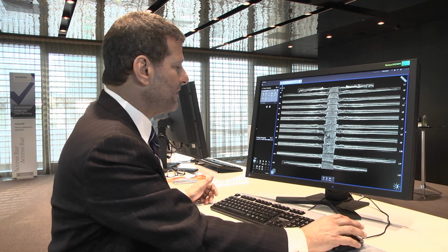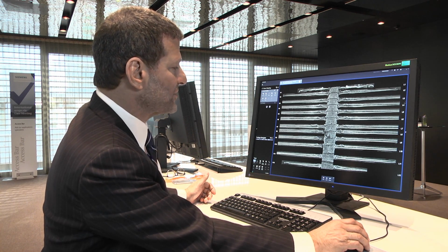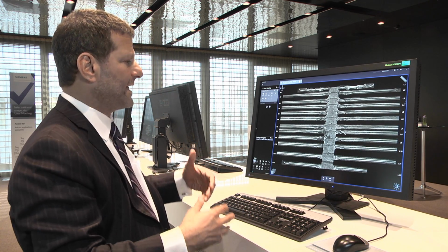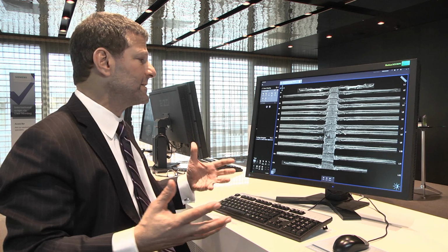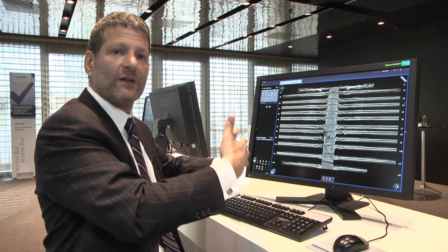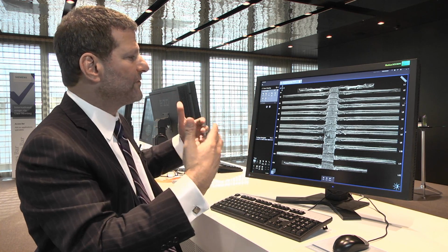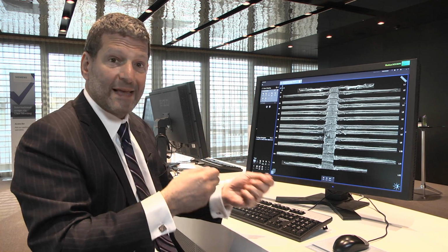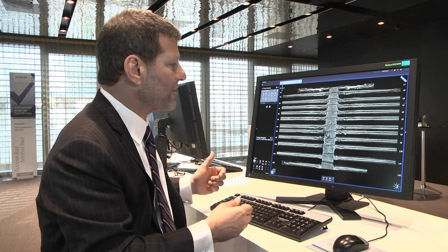I really can't tell you. Here you see a left 8th rib fracture. It's also very difficult to miss findings in a case like this that's full of myriad findings when it's all there right in front of my face. My brain is very good at integrating this type of information, much better than it is at trying to pull these out of individual slices. Very, very powerful.